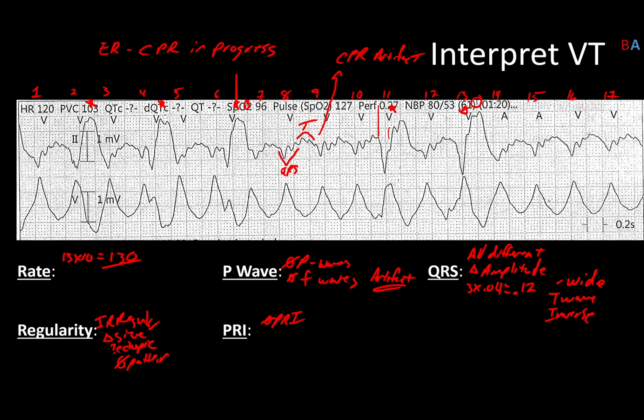Other things that we can make mention of, we can look at the sizes on them, just to see if there's any hints there. And you'll see that with the V lead and with the 2 lead, we definitely have plenty of beats that are well outside the margins on the scale. So that's another great hint that we're probably dealing with a VTach of some kind. And ultimately what I'm probably just going to call this one is another great case of polymorphic VTach.